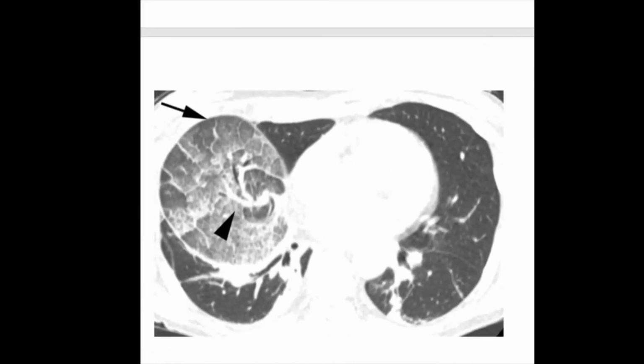Our last case here, another CT thorax lung window, and the arrows help out, but it's a pretty obvious finding, and we can see some consolidation or some increased opacity in the lung here, and we see this swirling. So this is an example of lung torsion, and this could be congestive edema, could be hemorrhage, or it could be active ongoing infarction. So those are the answers for the cases in my acute thorax series.